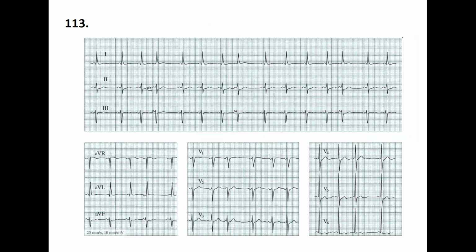I think I was supposed to do 112, but I accidentally did 113. Doesn't matter. It seemed very arrhythmic for the most part, so I tried to take the average of the full chart. I counted around 15 beats in 10 seconds, so I multiplied by 6 and got 90 beats per minute. It could be good, which is pretty high.